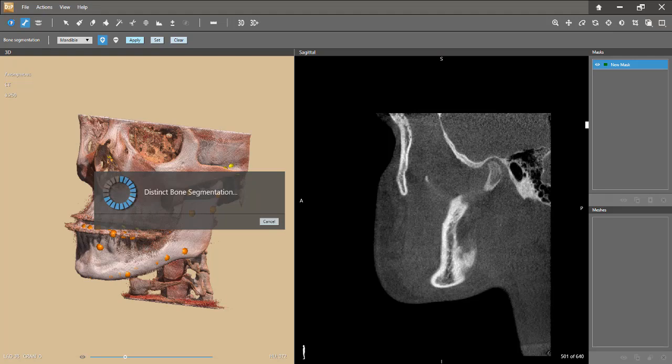Segmentation can take a little time. I think it will be about 2 minutes to fully calculate the bone segmentation. Something I did not do: you can choose to limit the working area to simplify the calculation, but because this one is already only the area I was looking for, I did not change anything.